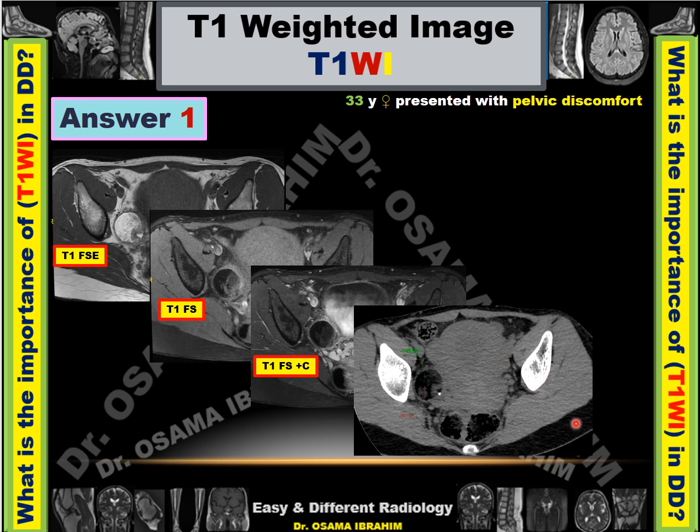Actually, the subcutaneous fat appears dark and the bone appears bright, so this is not an MRI sequence, this is a CT sequence. The CT confirms the presence of a fatty component in that lesion, which appears with minus Hounsfield units, as we measure here, minus 145 Hounsfield units.